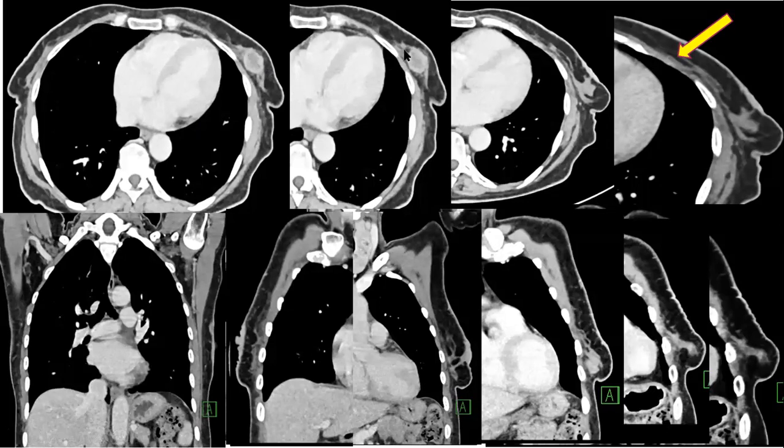Look at the ductal extensions in the two directions, and look for the satellite lesions here along those ductal extensions, approximating the chest wall. And here the arrow, this is an intercostal enhancing nodule within the muscle, signifying muscle involvement.